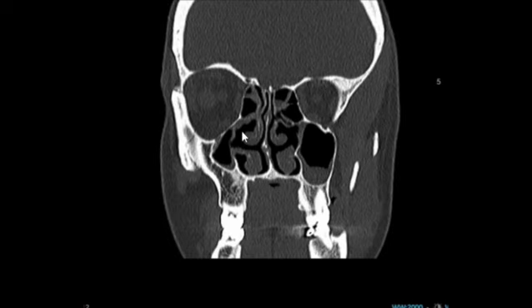Type 3, I have got one more interesting scan which I will show you in one more YouTube video. Type 3 is characterized by absence of the uncinate process and a profoundly hypoplastic, cleft-like sinus. So we have understood this.